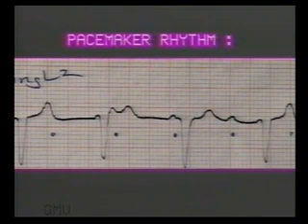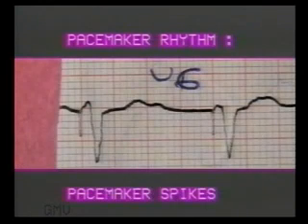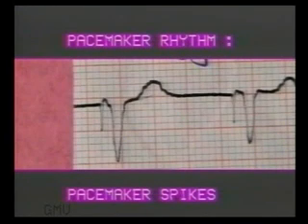We will be studying the heart blocks in the next chapter. Now in the chest leads of the same ECG, we can see a spike of pacemaker stimulation termed as pacemaker spike. Note the deep vertical spike followed immediately by a wide QRS complex.